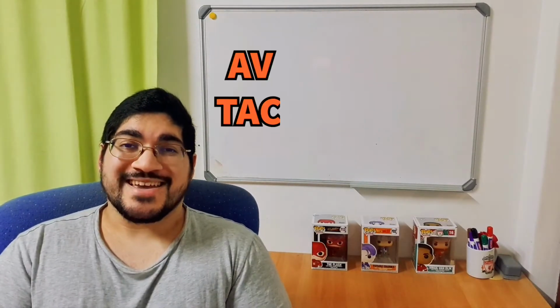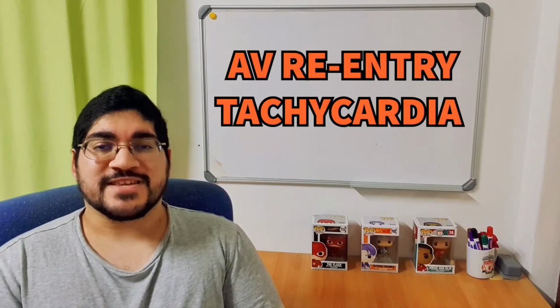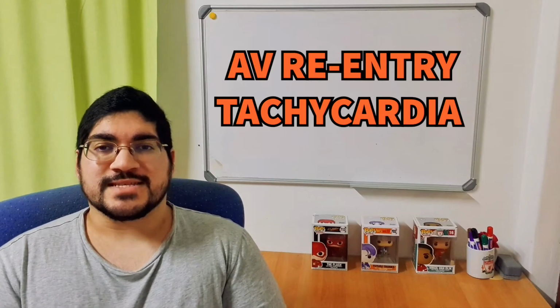The next one is called AV re-entry tachycardia, which sounds similar to AV nodal re-entry tachycardia, except that it doesn't go through the AV node. Right? It means that there's an accessory pathway somewhere connecting the ventricles and the atria. What that means is an impulse goes through the ventricle, then while it's going through the ventricle, it slips back through the atria and hits the AV node again, and goes back through the ventricles, back into the atria, hits the AV node again. So there's constant excitation of the AV node by an impulse that's getting back to the atria through the ventricles. So the SA node is kind of being overridden there by an impulse that's just coming back and looping on itself.